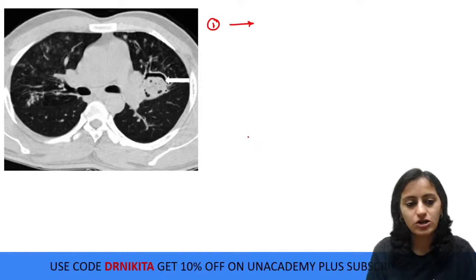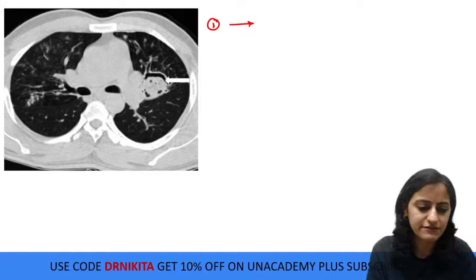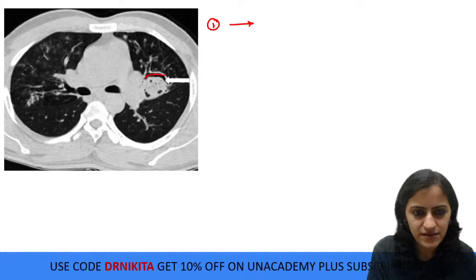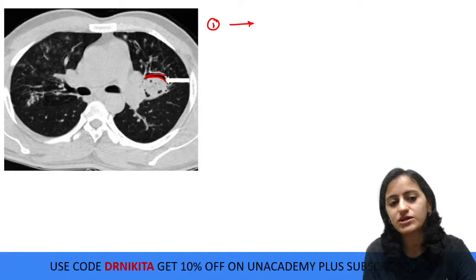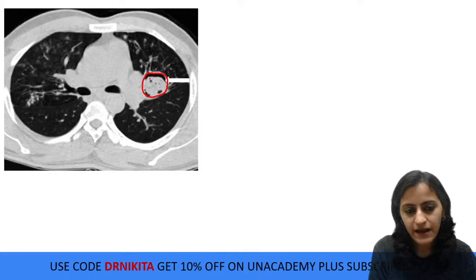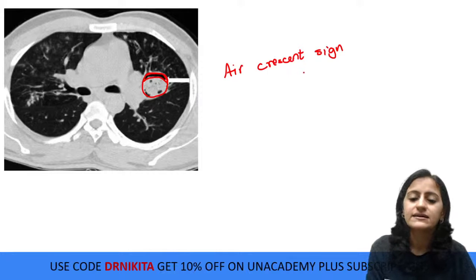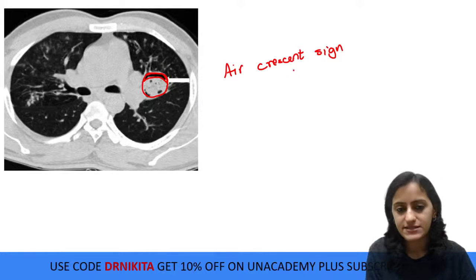Yes. So why is everyone talking about the tram track sign? If you are confusing this one, which looks like a bronchus, it is not a bronchus. Actually, this entire thing is a mass here, and you can see this air in this mass as a crescent above. This is the air crescent sign. Okay, that's your air crescent sign, not the tram track sign.